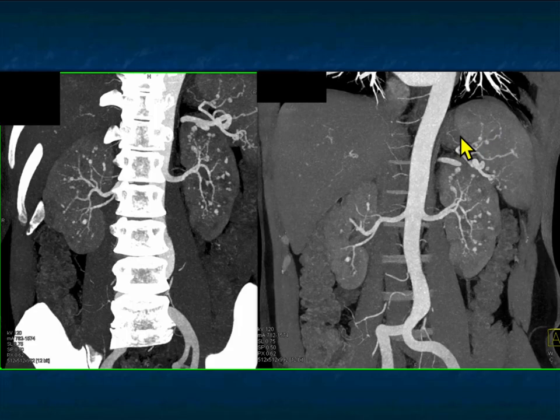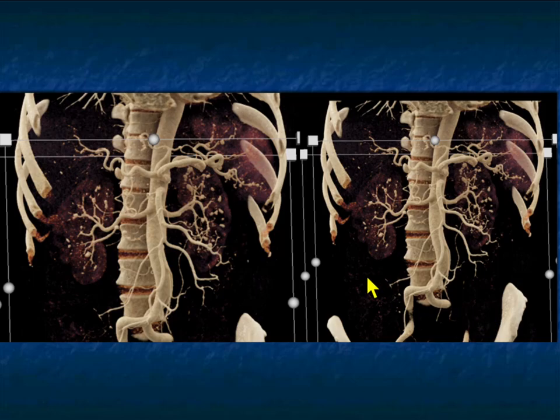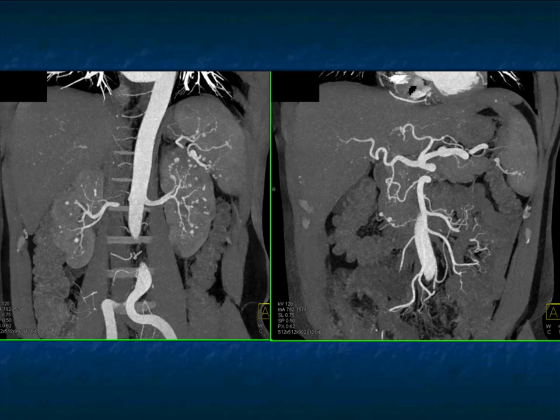There's also aneurysms in the splenic artery, aneurysms in the SMA, as well as very nicely showing you this with cinematic rendering. So again, making the point, PAN, classic renal involvement, but also multiple other vascular beds. So you need to look really carefully. A combination of MIP imaging and volume rendering works very nicely.